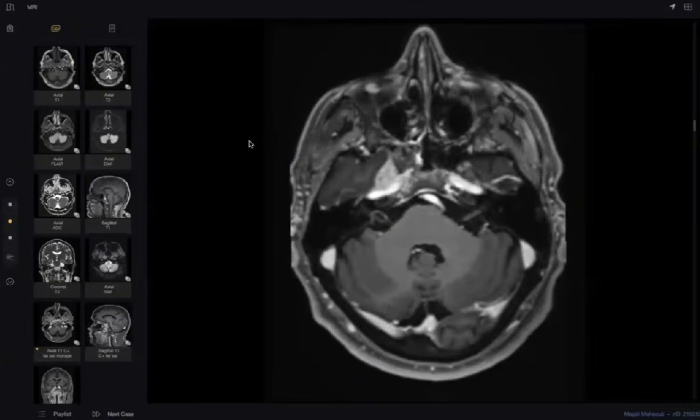My colleague, skull base is one of the very, very unpleasant areas for all of us, but we must study it. Look here, it is very obvious. This is the carotid, this is the cavernous, and there is soft tissue here.